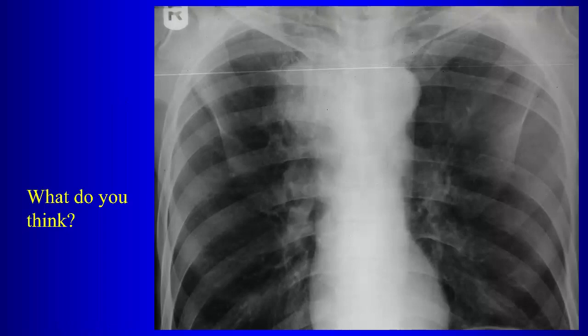Is there another finding on the chest radiograph? Where? Like in front of the scapula, maybe? Yeah, like rib distribution. Yeah, this rib is missing. Okay, so how do we put that together with this?